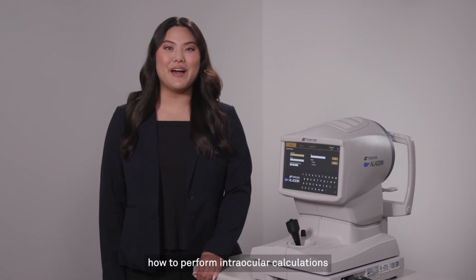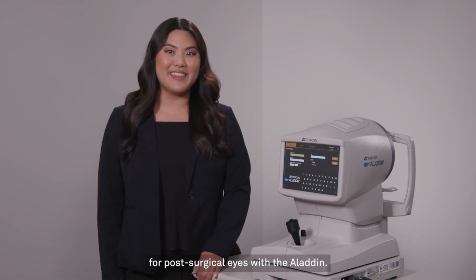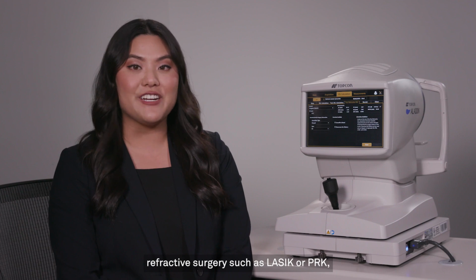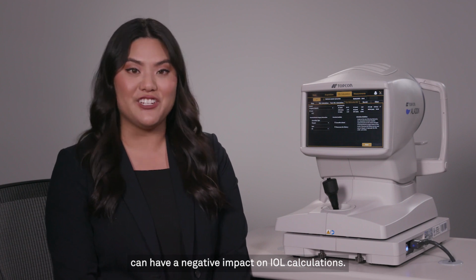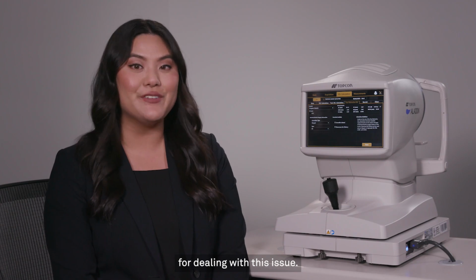Today I'm going to show you how to perform intraocular calculations for post-surgical eyes with the Aladdin. If a patient has previously had refractive surgery, such as LASIK or PRK, the alterations in corneal curvature can have a negative impact on IOL calculations. This is why the Aladdin provides several options for dealing with this issue.